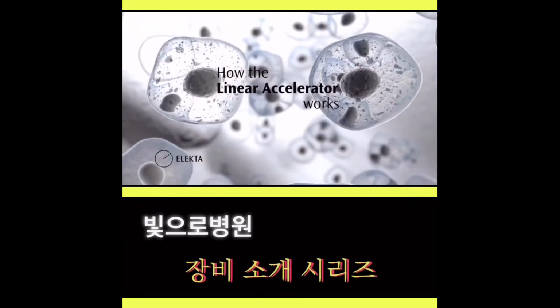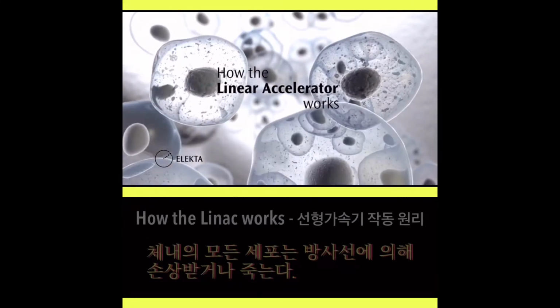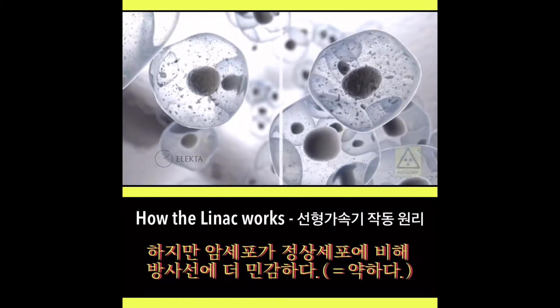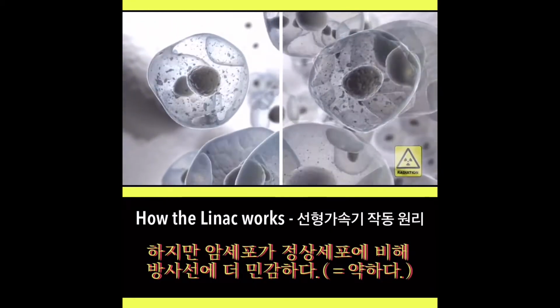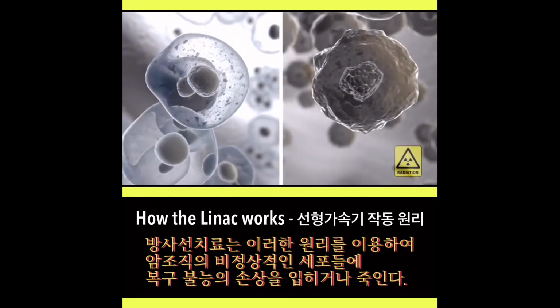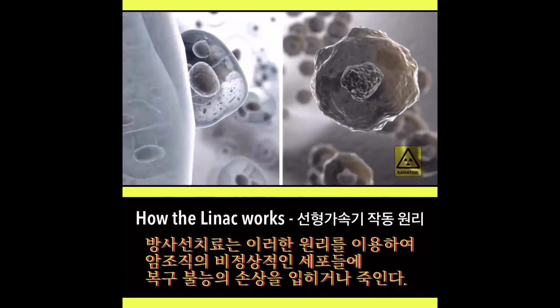How the linear accelerator works. All body cells can be damaged or killed by radiation, but tumor cells are more sensitive to radiation than normal cells. Radiation therapy uses this principle to damage beyond repair or kill the abnormal cancer cells in a tumor.